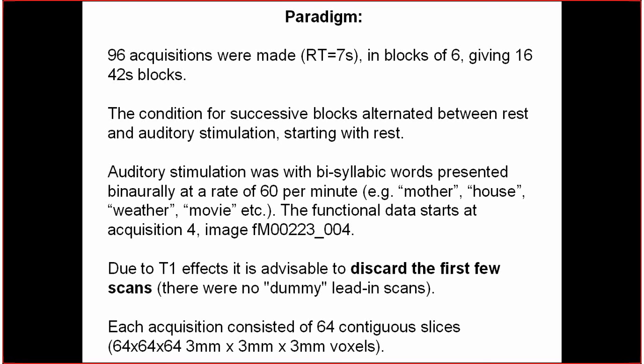In total, there were 96 acquisitions, 96 scans. Each scan took as long as 7 seconds, which is extremely long. Now typically functional scans take just 2 seconds. This was long ago.